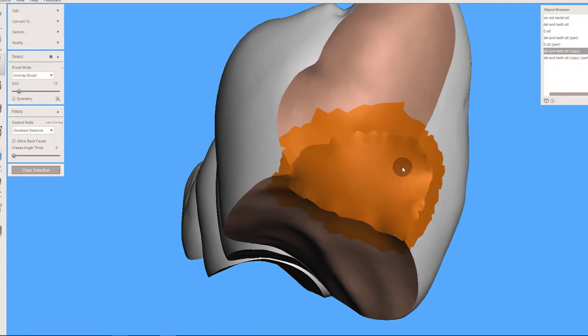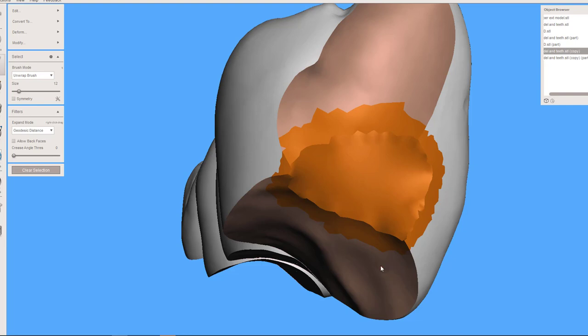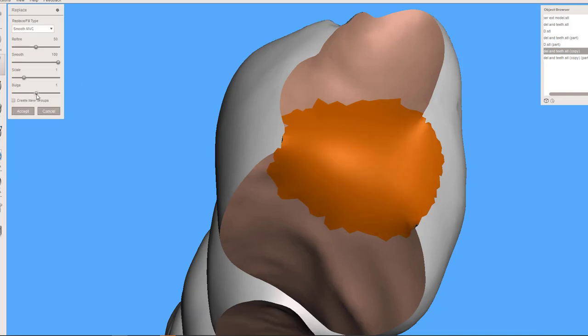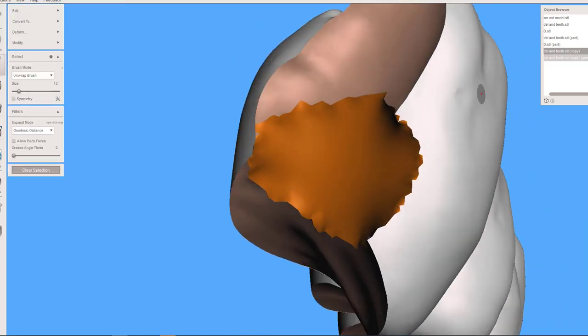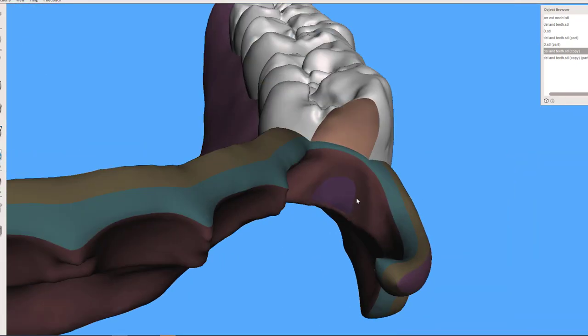So if I hold shift and greater than arrow, that is expand ring, see the greater than. So now I've expanded a bigger area and maybe I subtract a little bit more, F, and then drag back the bulge. This is not in an area that's showing anything, so I don't care if it's deficient, it's just going to have a little more resin occupying that space when these get bonded together.